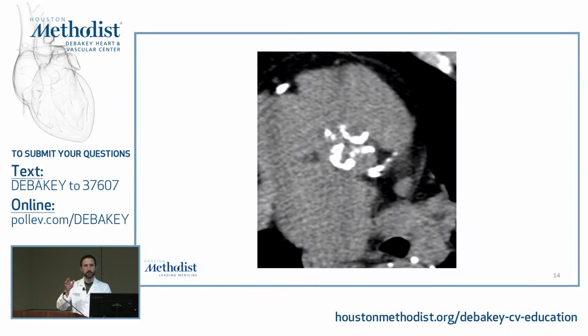The best is to do a double oblique, so you can know exactly where that calcification is, because you want to make sure you exclude any aortic root, mitral annular calcification, or coronary ostial calcification from your aortic valve measurements. And then all you do is a ROI.